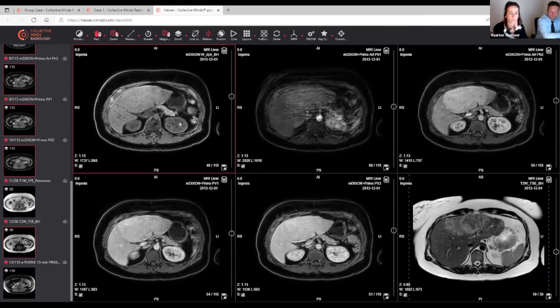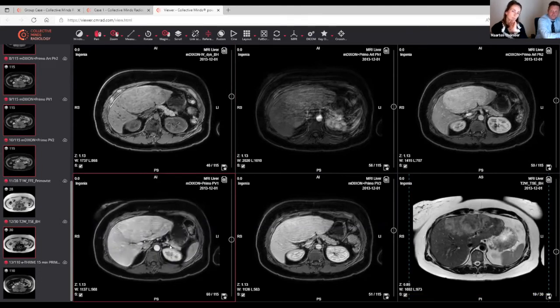I think this is an inflammatory adenoma. And the others also, probably, yes. Yeah, I think all the lesions. What would you advise now to the clinician? What should the surgeon or the clinician ask of you?